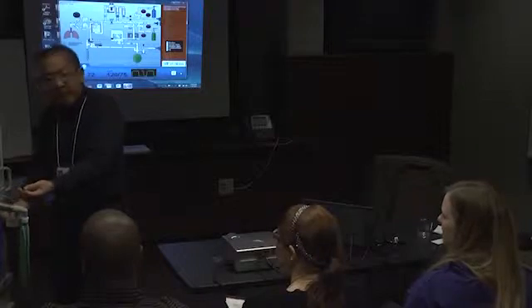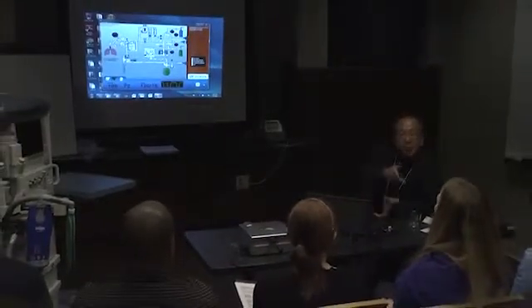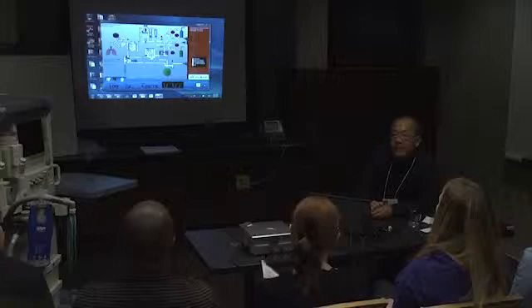you reconnect it, you hit the flush, and you see that it goes to over 90. But the real answer to this is actually maybe. It's not yes. You're right when you say yes, but you're partially wrong too, because the answer is maybe. It depends. Why? It depends on what's hooked up there.